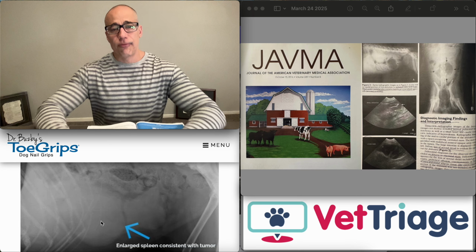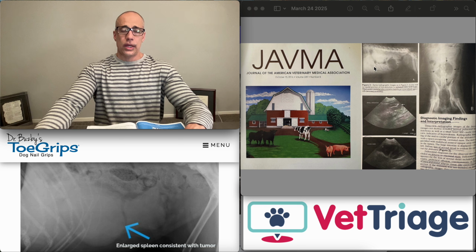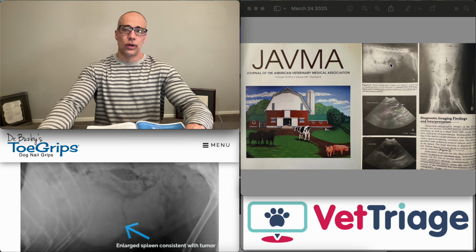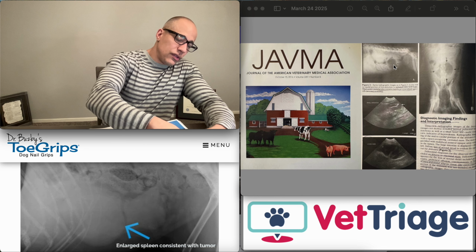So that's it. Pretty straightforward. I think the uniqueness of this comes in that the radiograph showed a gas-filled mass. And so you're thinking like abscess or an intestinal mass with necrotic center or maybe it's a very severe focal dilation of intestine. But otherwise, this is a pretty routine case. But I think that's probably why they decided to publish this one.